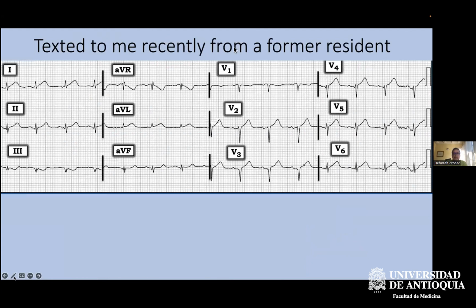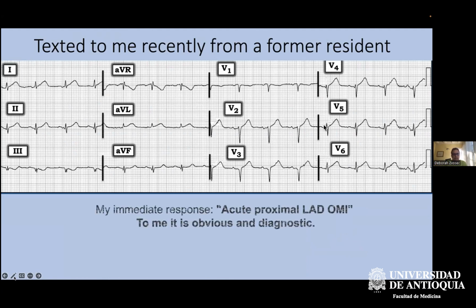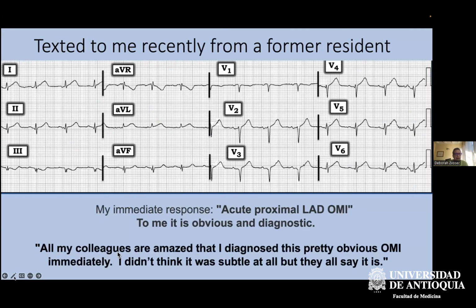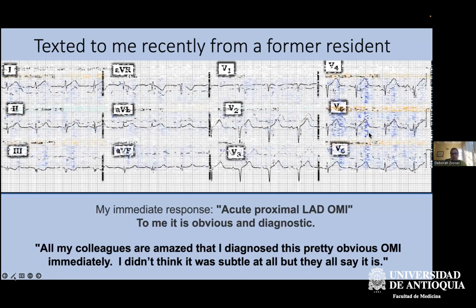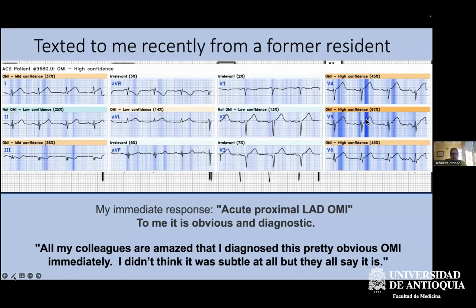This was recently texted to me from a former resident. Big T waves, big T waves. And I texted back, acute proximal LAD OMI. To me, it is obvious and diagnostic. He texted back, all my colleagues are amazed that I diagnosed this pretty obvious OMI immediately. I didn't think it was subtle at all, but they all say it is. And again, I can't tell now what's subtle and what's not, but the Queen of Hearts doesn't think it's subtle. She says OMI with high confidence. And the explainability map tells you why.